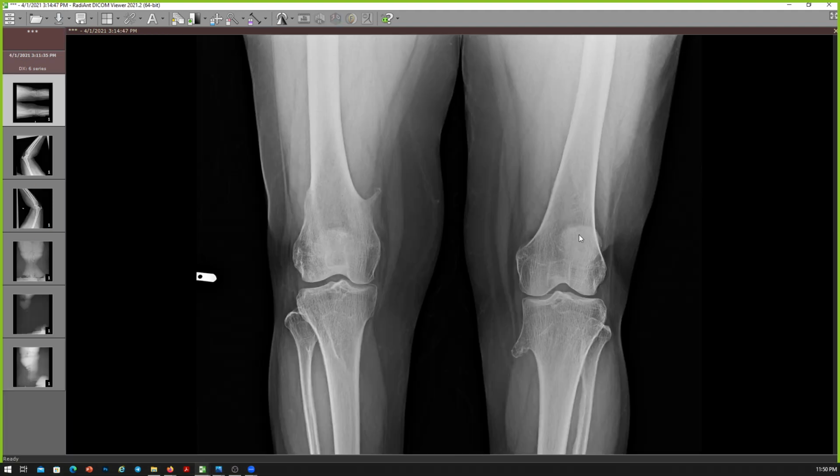This one, right? So this again was, you did this case perfectly. I would have given you an 8 out of 8 if I were your examiner. You described the findings very well. You said that they are pointing away from the joints. You completed the case with the MRI findings, that you'll tell that the cartilage cap is more than 1.5, that you'll be worried about such a finding. So everything was perfect about this case.